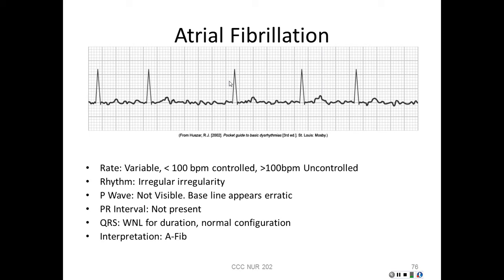One of the things that you will notice about atrial fibrillation, and it's the hallmark of atrial fibrillation, is it is an irregular rhythm. There is no pattern to the QRSs. There's no logic to which impulse gets through that AV node to initiate a ventricular contraction or a QRS complex. You never know which one's going to go through. You may see long distances like this one. It may be even shorter distances like this one. Or you may see a couple of short ones and then a long one. It's very irregular as you look at that.